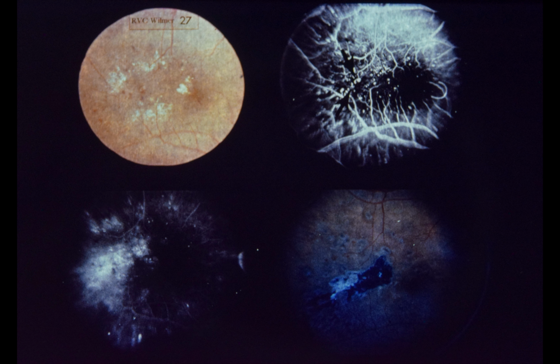Comment: vascular abnormalities are invariably found inside the center of a lipid ring. It is important to recognize that the entire area within the lipid ring is edematous, not just the hard exudate. As one proceeds centrifugally from the abnormal leaking vessels at the center, there is some reabsorption of edema.